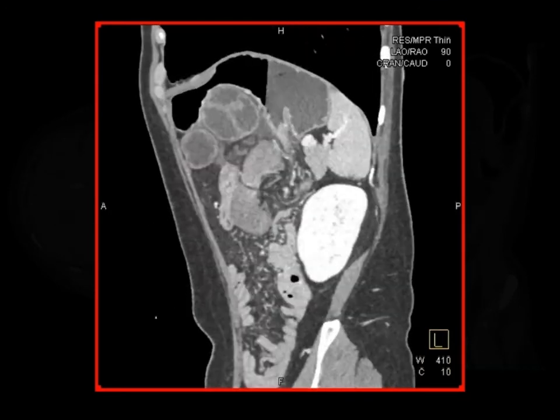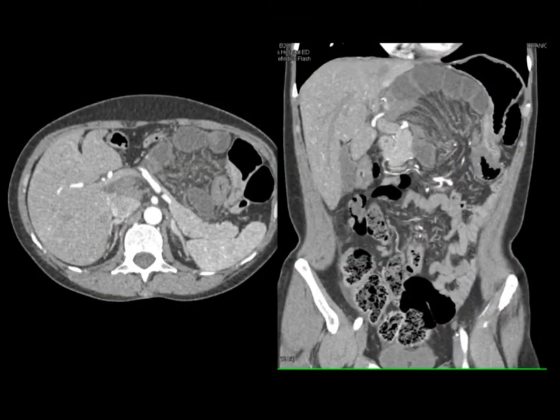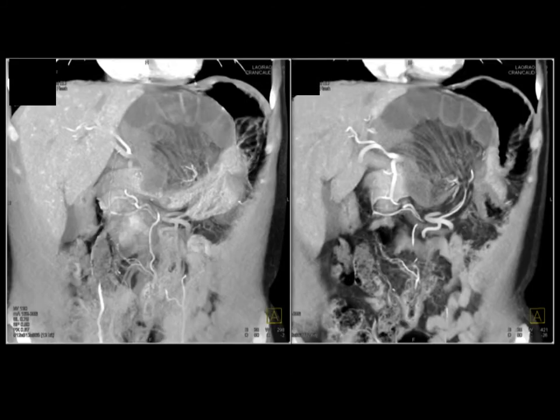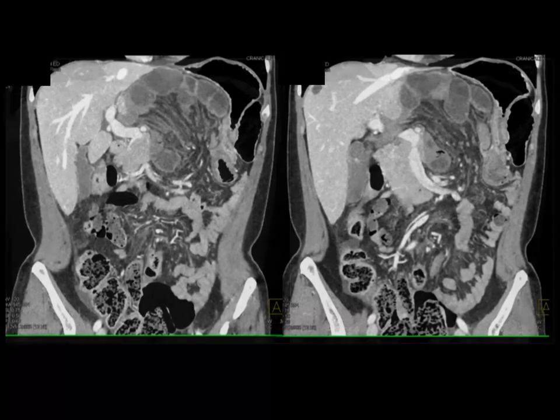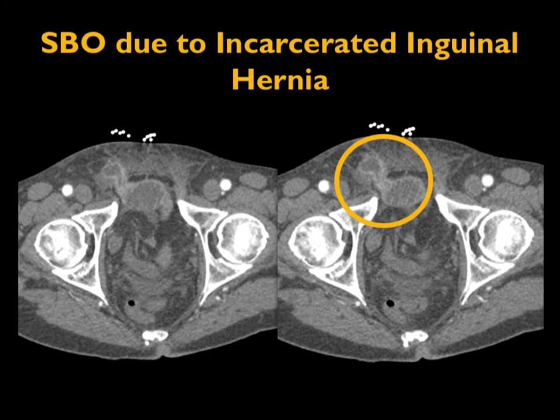So you can see there's a hernia, an internal hernia, and when you look at those two images, just static, just a beautiful example of dilated bowel, decreased enhancement, prominence of the vasa recta, edema, minimal ascites, and the bowel is where it shouldn't be, beautifully shown on the 3D images or even on the coronal displays. So again, just a very, very nice example of an internal hernia and the important changes you can see with CT angiography.